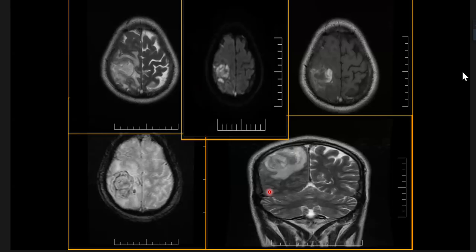I feel it's the high frontoparietal convexity. How do we divide it? By knowing the level of the central sulcus, which is in the depth of the gyrus. Because of the lesion, it has distorted. This one going in the depth of the gyrus looks like the central sulcus. So it is in the post-central sulcus region, postcentral parietal.